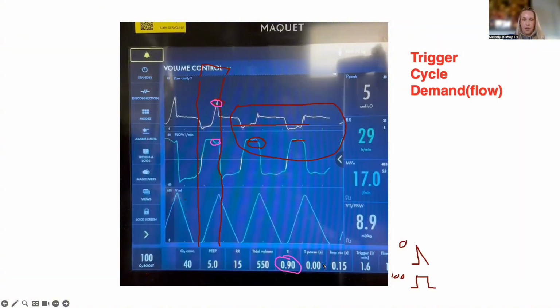Yeah. I think because of how tachypneic the patient is, he's pulling down super hard, then blowing out super hard, which is why you get this peak expiratory flow of -60, which is pretty high. You don't normally see -60 in normal lungs. Certainly you could see it in ARDS. I guess it's not the highest ever, but it's not -40. -60 is pretty high.